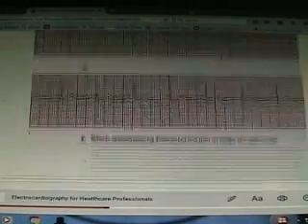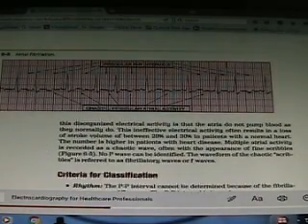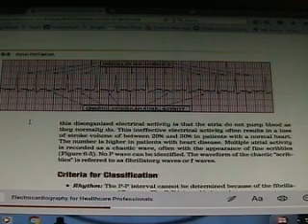Now, what happens when it can't do it anymore, when it starts messing up? You get this thing called atrial fibrillation. You see that there's no more P wave? Everything is nuts. Fibrillation is an emergency trace. If you see AFib and the patient has no history of AFib, because there are some people who have a history of it, and then they take medication, so to them this might be normal. I mean, it's not a normal situation, but you could see that. So if you see on the chart that the patient has a history of AFib, or atrial fibrillation, you can see how chaotic it is.